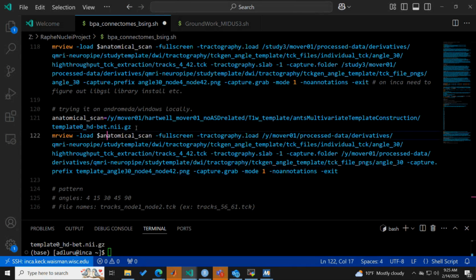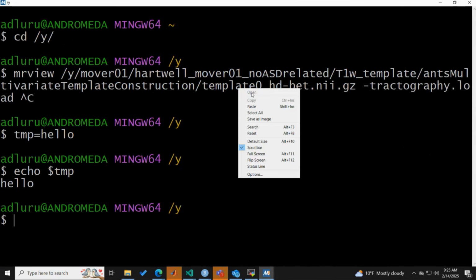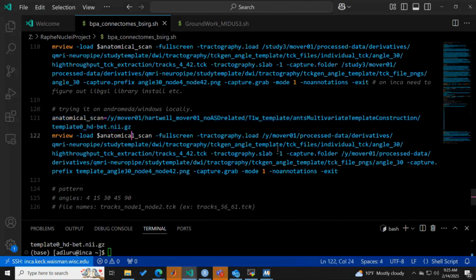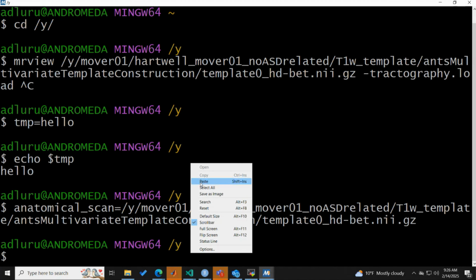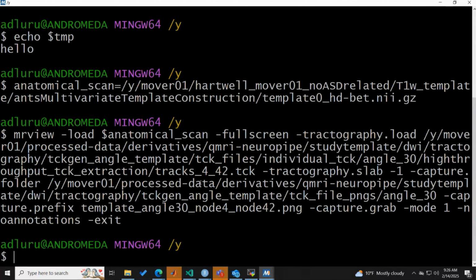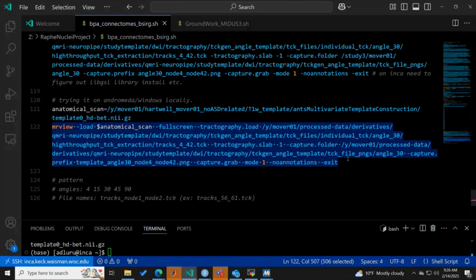Okay, here we go. Time to test. I'm setting the variable. We'll take the full thing first, and if not, we have to do it piecemeal. Oh, it actually loaded it. Can you guys see on your end if the PNG got created? Let me check. I could also try without the exit.